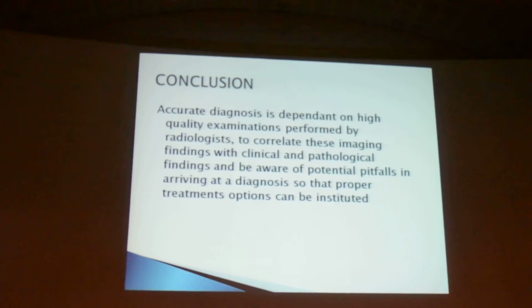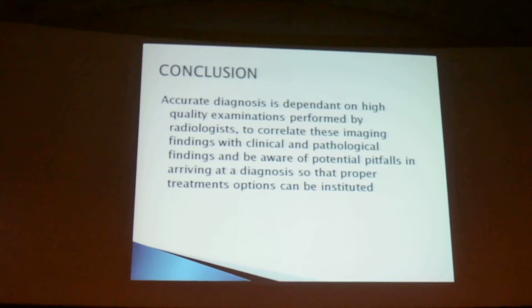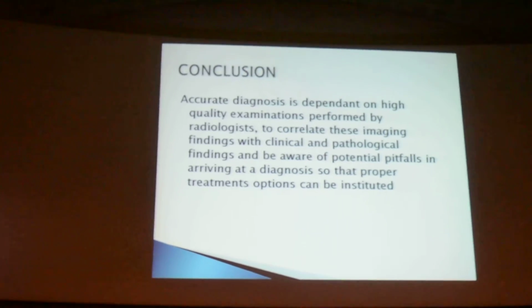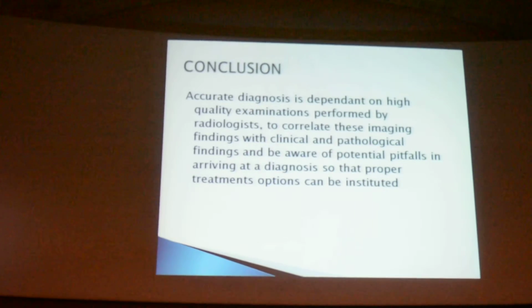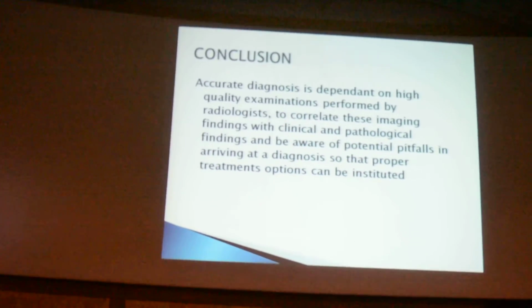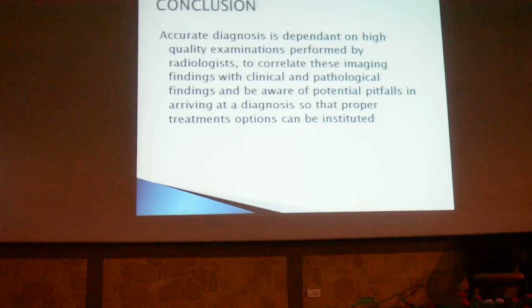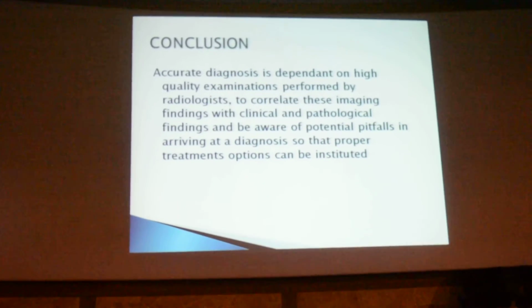So we have seen how you evaluate a mass if it is an incidental detection on a routine screen and also CT or MRI. The technique is very important, and it is very important to know what are the conditions that can mimic enhancement or pseudo-enhancement, mimic a mass, and how to differentiate an enhancement from a pseudo-enhancement. These are the important features to differentiate these renal masses.